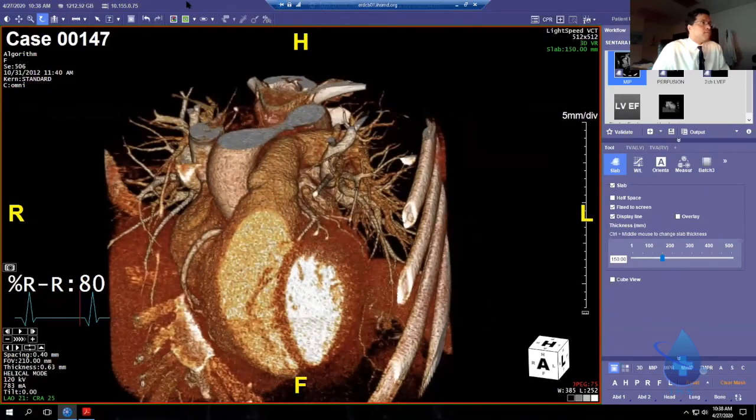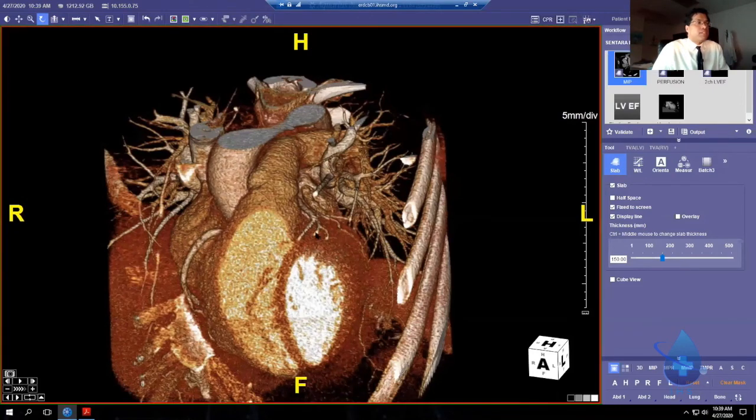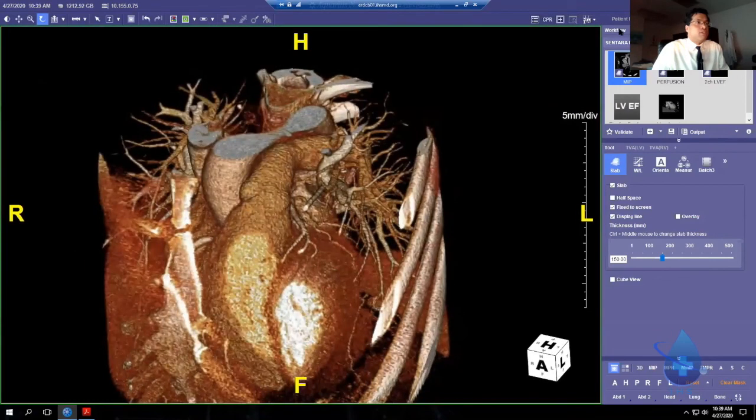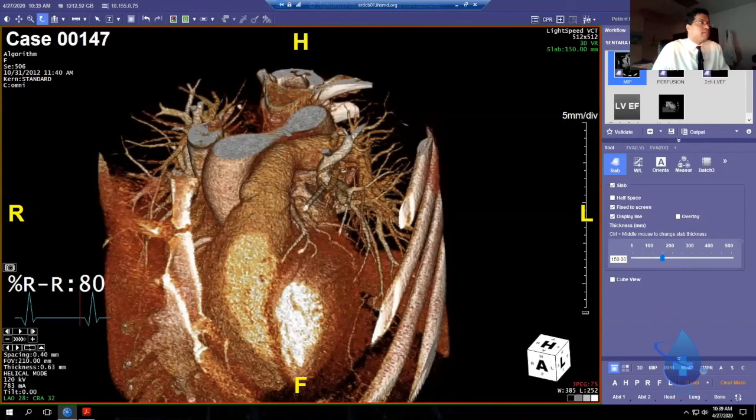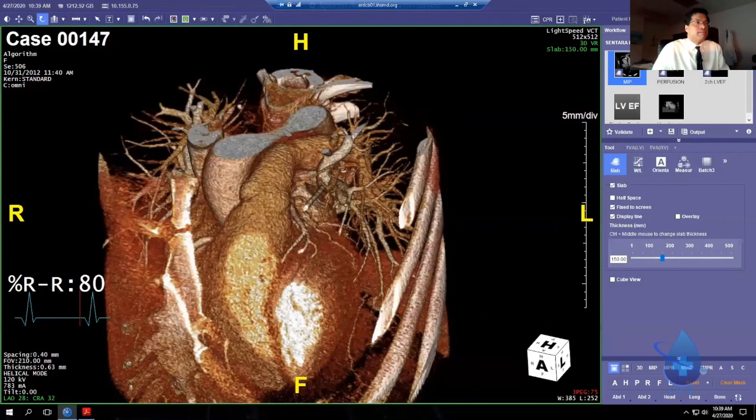Now, that's it for buttons up there on the left top. Over here, there's a button that will turn on and off annotations. Like if you want to turn off all the annotations and manipulate it without all that noise, you can do that. Or if you want to take a screenshot without any of that stuff, you can do it. There's 3 tabs here. You can go to patient list and it'll take you right back to this list where you just were and go back to viewer.